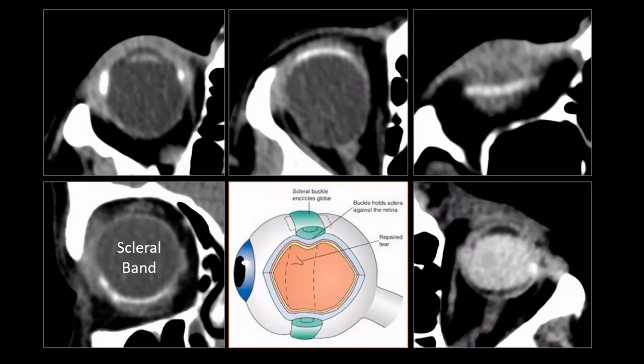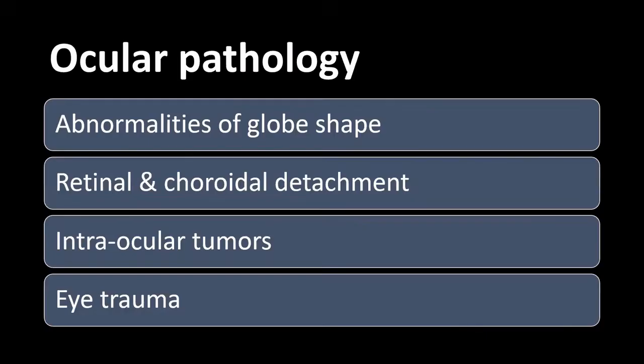And another technique that can be used is the intravitreous injection of silicone, as you see here. We see an eyeball with a very dense content. If you don't know any better, you'd say, well, this might be blood, but it's generally even more dense than blood. And this was an intravitreal silicone injection. So before calling this an intraocular hemorrhage, maybe consult your ophthalmologist if maybe this patient didn't receive an intravitreal silicone injection because of retinal detachment.